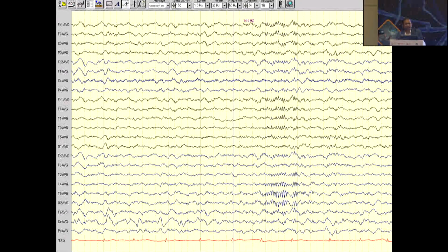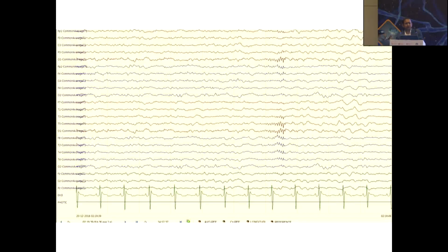So in this case, these are looking like spindles, but if you see carefully, they are very sharp and they are looking down in the referential, indicating they are positive. And the frequency will be fixed, 14 Hertz in case of 14 and 6 Hertz in case of 6. Again, they may not last for 1 second. They may be appearing only for half a second. In half a second, if there are 7 activities, that indicates 14 Hertz.